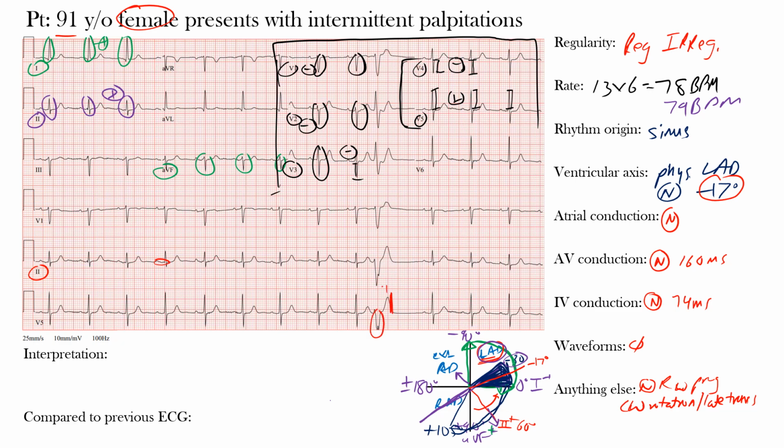And this is that big T wave that you see there. So you have a QRS complex coming sooner than expected, no P wave seen there, okay? So no P wave, and again, then you have the beat that comes after, and again, this would be compensatory pause because this would be two R to R intervals, okay? So from this to this is an R to R interval, okay? But this is two R to R intervals, meaning that we have a compensatory pause, and it's something we typically see with PVCs, or premature ventricular complexes, okay?